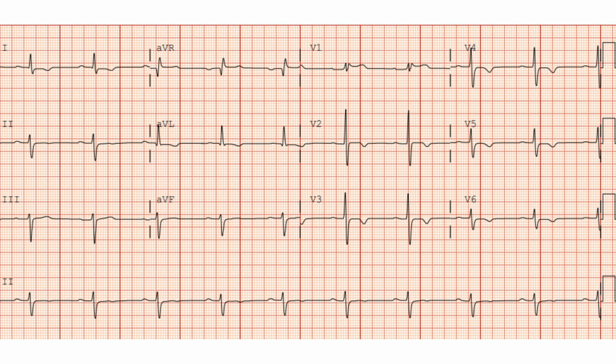Okay, this is his previous EKG. Remember, this EKG is to establish a baseline. So I want you to pause your video for a couple seconds and try to just interpret this and write down what you think before you hear what I say. Okay, so on this EKG, remember to establish the baseline. There's multiple abnormalities, but just on the EKG, you can't tell if they're definitive pathologies.